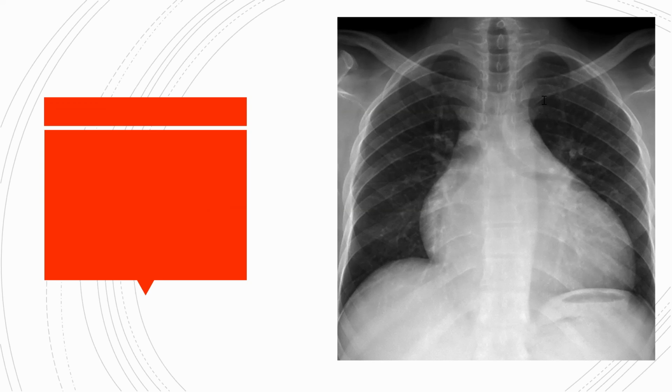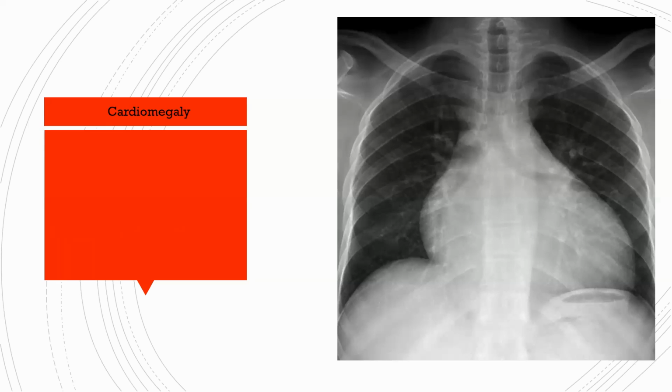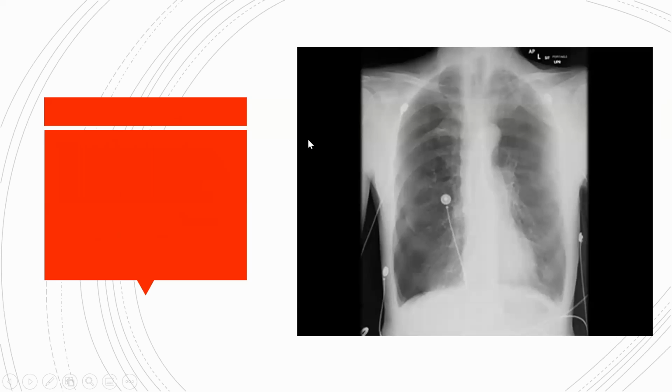Yeah, someone says, wow, and I'm like, yeah, it's rather large, isn't it? Yeah, it is cardio, let me check. It is cardiomegaly, yeah, it is heart failure. Do you know the symptoms of heart failure, which is swelling, difficulty breathing, etc.? So, yeah, he has ankle swelling on both sides, okay. Shortness of breath. Yeah, moving on for the sake of time.